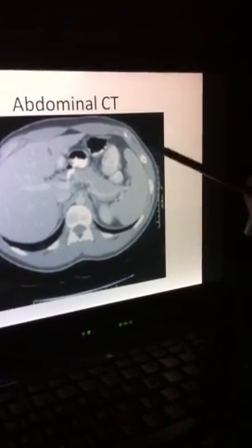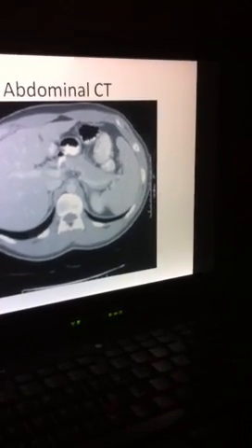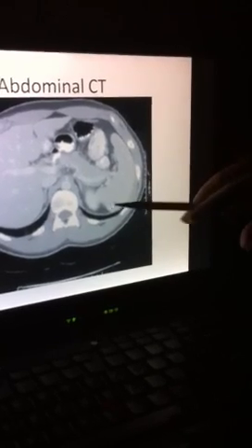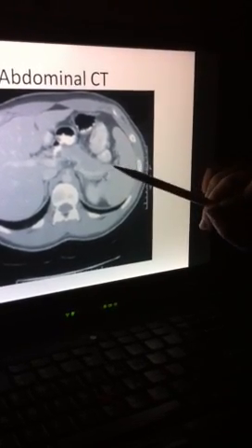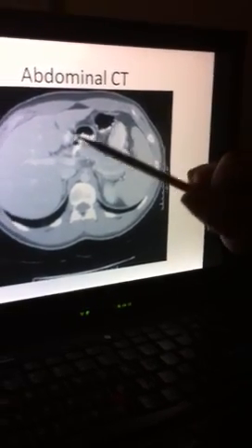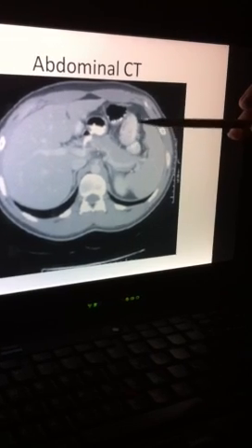And that's right here. Pancreas? Mm-hmm. The kidney? Not the kidney. Not the stomach. You're lower than the stomach. Spleen. The spleen, yes. It's just really large, so it may have thrown you guys off, but it is a spleen. You can see some of the vessels here. This is part of the small intestine right here. And then you got this guy right here.